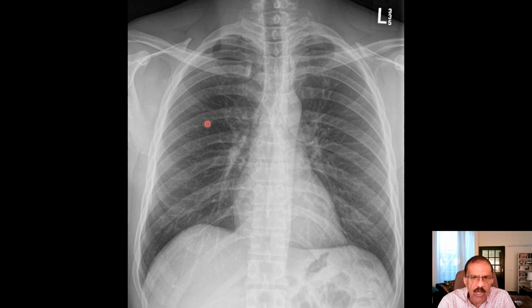You see these pulmonary markings, these are called pulmonary markings. On this X-ray, the lung fields are not absolutely characterless, because the lung also has parenchyma. Lung is air with parenchyma, so you will see these small markings. Now you have to see multiple X-rays to make a good impression of how much of this shadowing is normal. If there is too much of this shadowing, that could be a manifestation of some disease. But this one is normal. So I think you need to familiarize yourself with what is normal and what is not. And the only way is to see multiple X-rays that will print the impression in your mind.